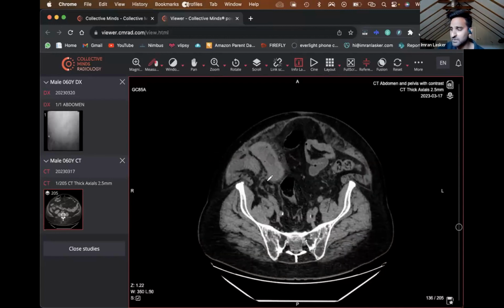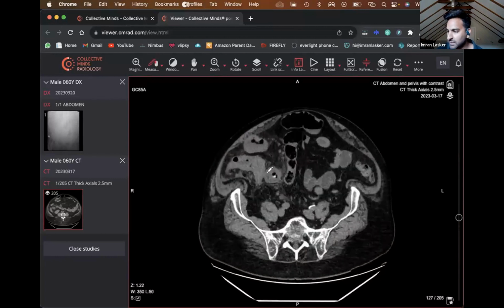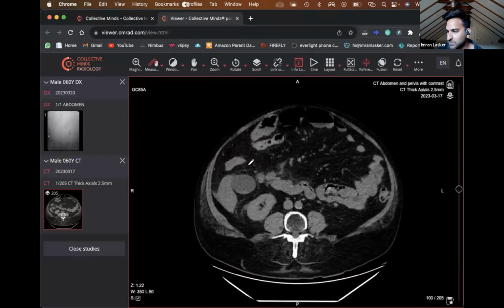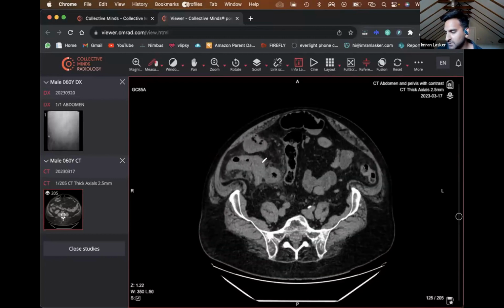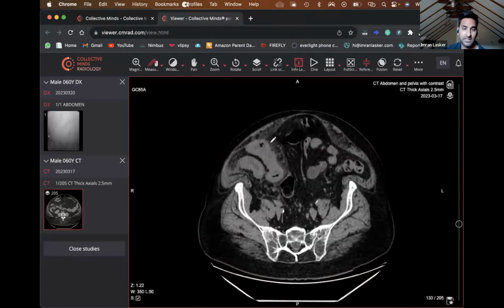But actually, most of the pathology is located within this area of bowel. When you follow that piece of bowel upwards, it should go into the cecal pole. So the cecal pole is going to be somewhere here and then kind of continues in, around this area here. So actually what you're looking at is exactly right: terminal ileitis. That can be for a few reasons. You can get backwash ileitis, you can get Crohn's disease, and I think some infections like Yersinia can cause terminal ileitis as well.